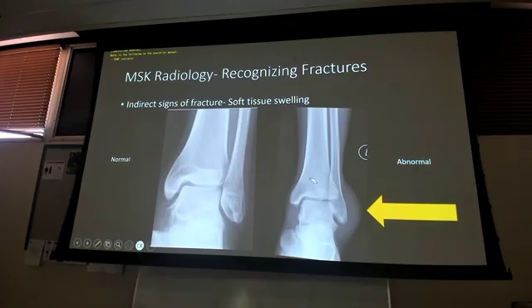So, that subtle radiolucent line definitely got the tibial fracture. And because of the soft tissue swelling, maybe I have an occult fibular fracture somewhere there that I can't see. But I don't know for sure. But this is the fracture I wanted to see if you guys are able to pull out. If you did, awesome. You didn't, it's okay. It's a subtle one, right?